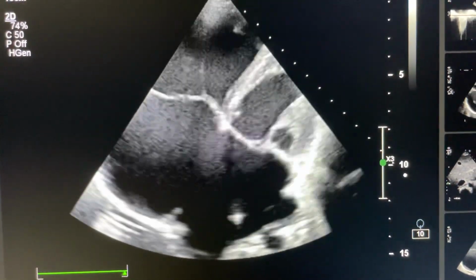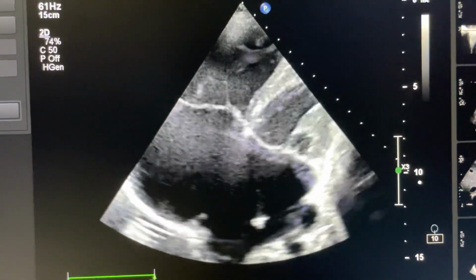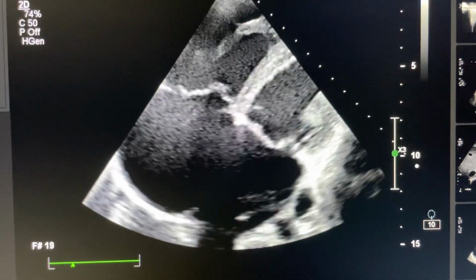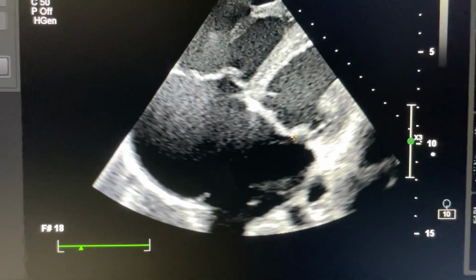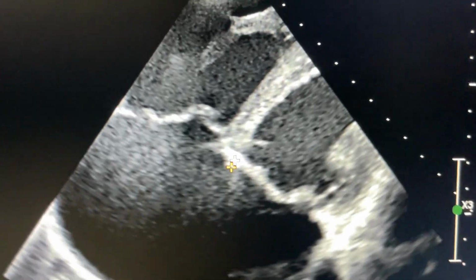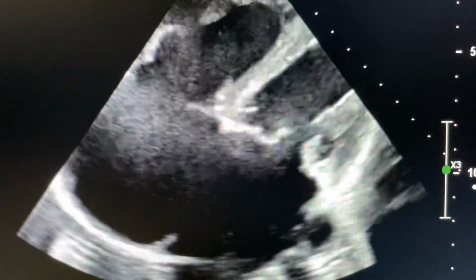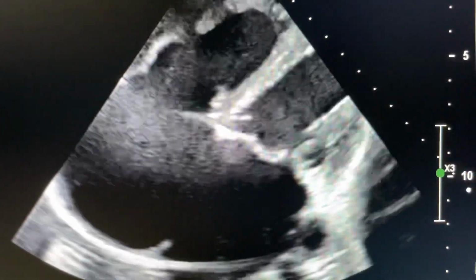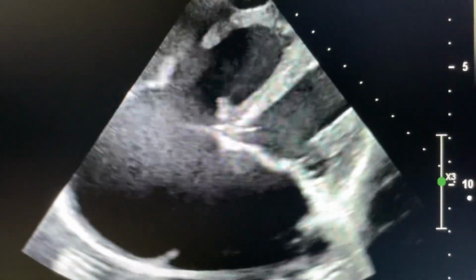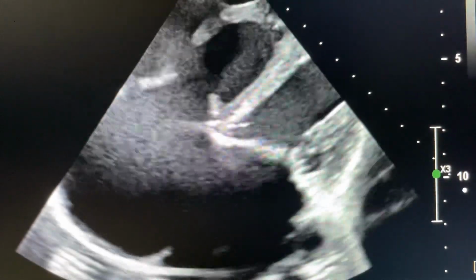First thing, you will try to find the supramitral margin. In case you get a supramitral margin, so this is the supramitral margin, this portion. Whenever you get a supramitral margin, that indicates ostium secundum ASD. If there is no supramitral margin, no margin of interatrial septum above the mitral valve, in that case it is ostium primum ASD.